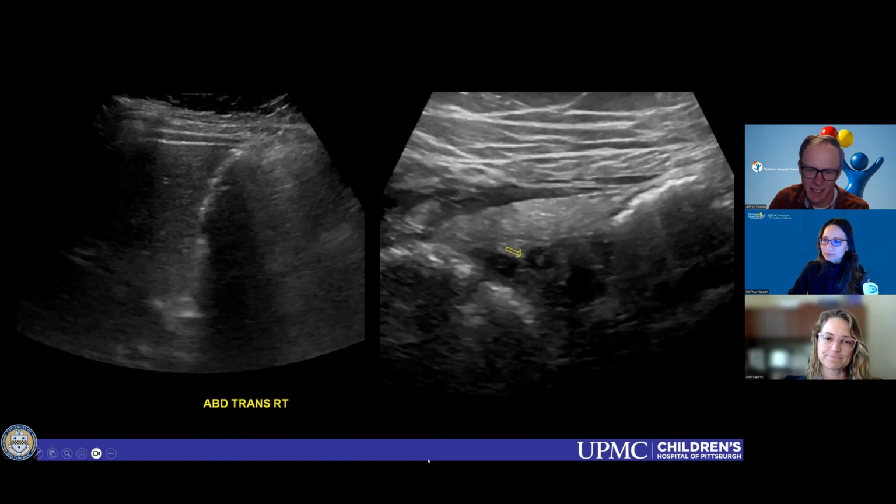And on that image you're showing there, I really try to figure out exactly where the inflammation is centered. With the appendix, on the deep aspect, the fat looks relatively normal as far as I can tell. Sometimes we don't get as good quality imaging down there on the deep part, but as far as truly calling it periappendiceal inflammation, I try to really localize exactly where that inflammation is centered. And I agree, at least to me on this one image, it doesn't look like it's centered at the appendix. Yeah, it was all anterior. So good point.